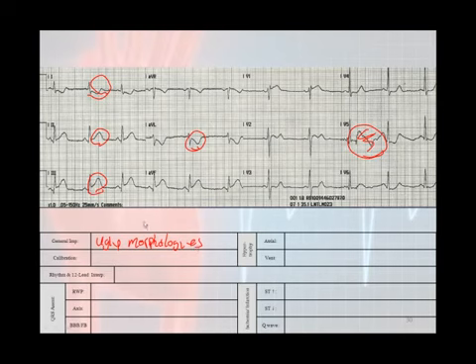Calibration. Now the calibration markers kind of look like they were cut off over here, but we're going to just say that this is standard calibration. 12 lead, rhythm interpretation. We can't really use a rhythm strip down at the bottom because there is no rhythm strip down at the bottom, so you kind of have to look at a couple leads and put these together. So it looks like V3 and V6 are kind of the same.